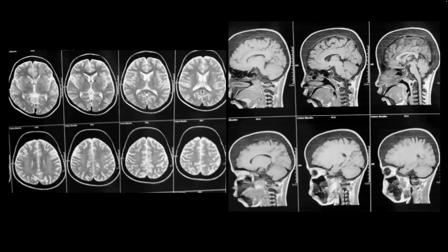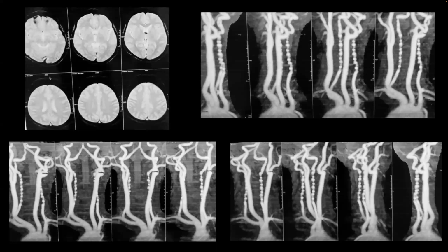So generalized cortical atrophy with subacute white matter changes on the MRI. On the SWI sequences, there are no focal areas of hemosiderin or calcification. With the angio, I don't have a source image again. These are only MIP images, and you can appreciate this alternating flow of beaded appearance in the bilateral vertebral arteries, almost like a string of beads appearance, which you commonly see in fibromuscular dysplasia and vasculitic syndromes.